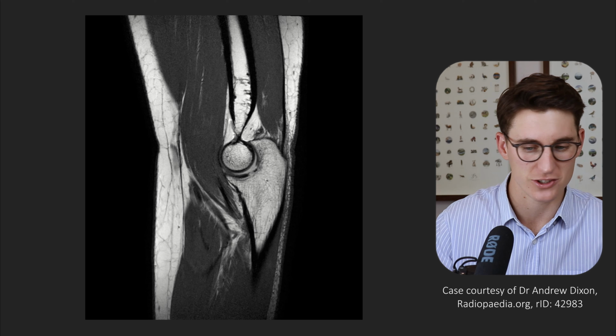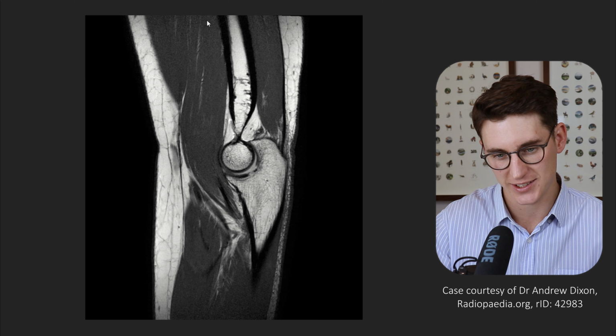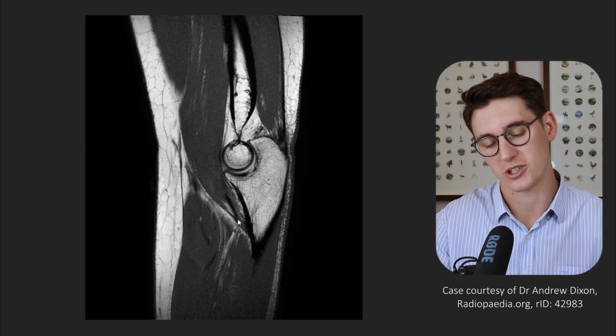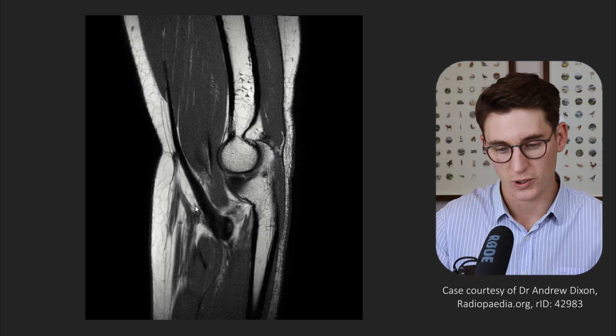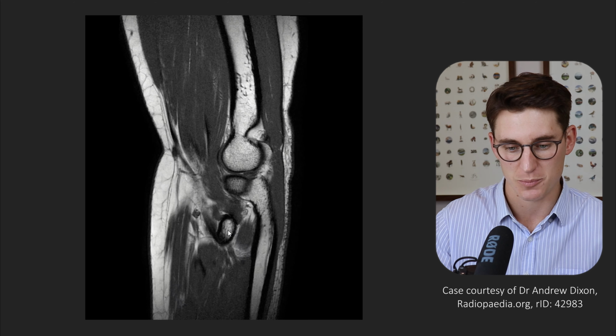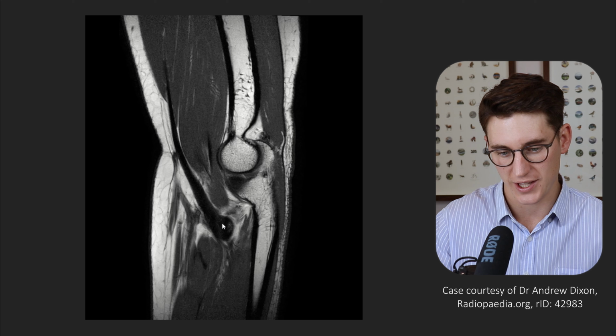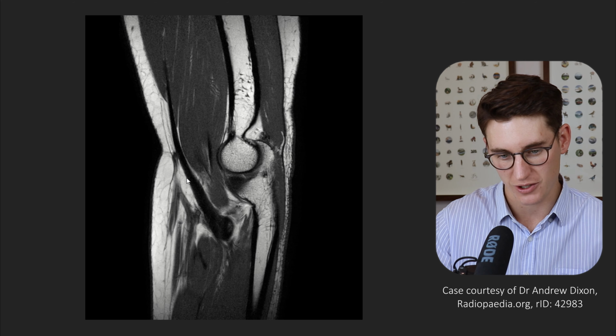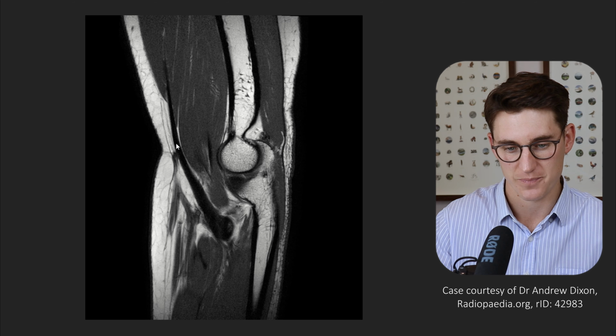Let's have a look at that on the sagittal PD. It's much easier to see. Here's our brachialis coming from that anterior portion of our humerus and inserting onto that ulnar tuberosity. We should be able to head out more laterally and see this large biceps brachii tendon that attaches to that radial tuberosity. Here's our radial bone, that medial surface of our radial tuberosity heading across there.